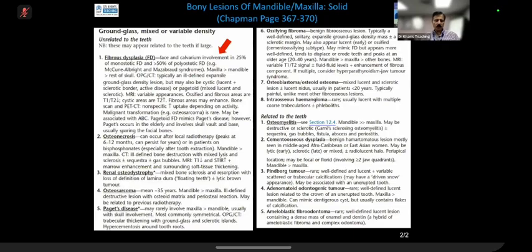The basic pathology is that these are cysts in the bone, and then there is variable degree of ossification, and at a particular time that ossification might give you a ground glass matrix.